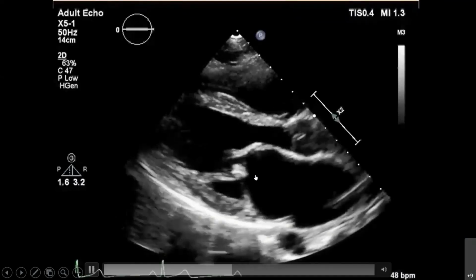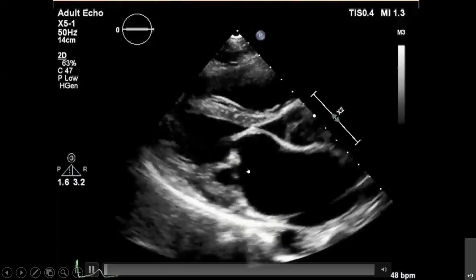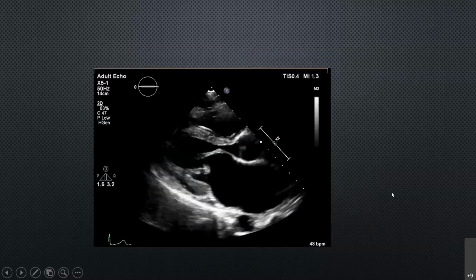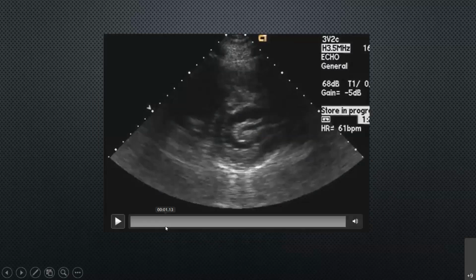So this video, I think, helps a little bit more. It starts at the tip and progresses towards the base. I think there's a delay, guys. Give me 1 second. I do want to show you something.